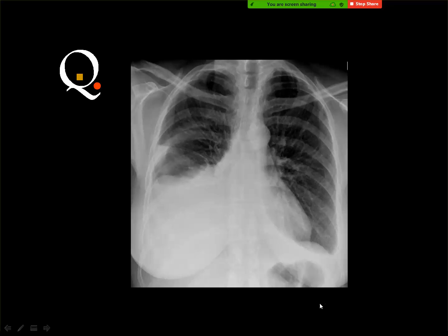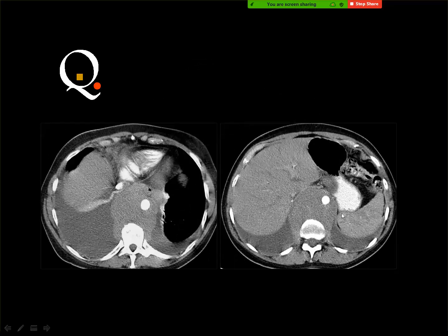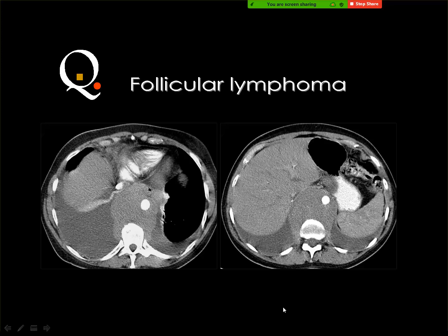Pleural effusion, the right lung. There is a mass outside. And another effusion here, but if you look carefully at the surface of the effusion, it is not the crescent sign. It is associated with the mass. Upward. Then you suspected that there is a mass underneath the effusion, and you got a mass. And this mass is big. It's lymphoma. Yes. Lymphoma. Non-Hodgkin. The aorta, the floating vessel sign, pleural effusion, and this was proved to be a follicular lymphoma. Very good.